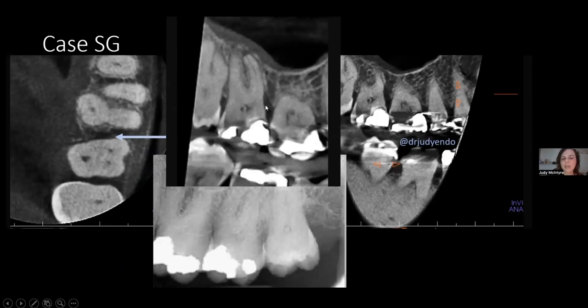So once again, this is really the furthest extent, right? I would say that this might even be maybe a hint more towards 25% of the root length, right? But this is the farthest extent that I want to save. We're having serious conversations with the patient. In fact, she left. I got on the phone with the general dentist.